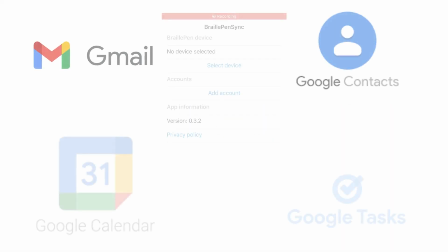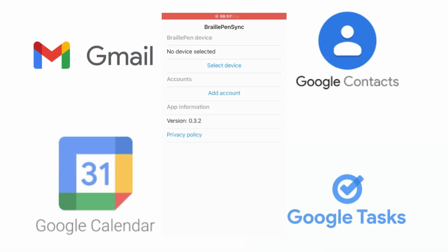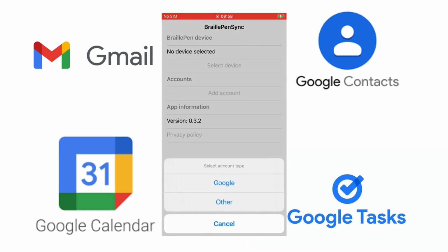To access data from their Google accounts, the users will need to log into them in the BraillePenSync application. They can do so by pressing the Add Account button. Then they will be shown the selection sheet on which they should select Google. The application will display the alert to confirm signing into Google account. To continue, the users will need to press Continue.